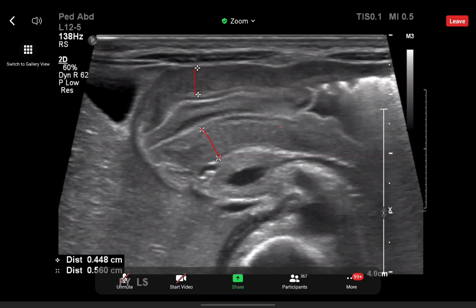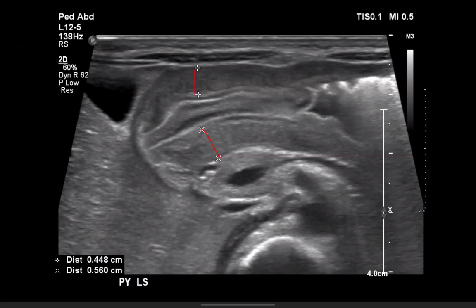Sometimes images are very borderline, in which case what you should do is repeat the ultrasound after 48 or 72 hours. Usually once it begins to hypertrophy, it hypertrophies very quickly, and you will see a change in as little as 48 or 72 hours. Remember, your canal length is also important. The canal length shouldn't really be any longer than 15 millimeters. Certainly 16, 17, 18 millimeters is too long, and it's elongated because it's hypertrophied.